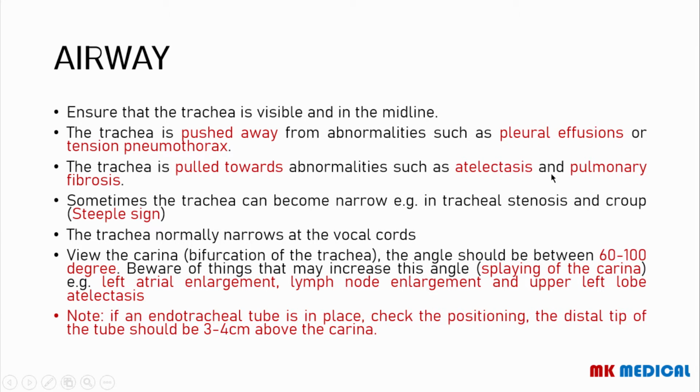You refer to that as splaying of the carina. Splaying with an L, not an R. So it's splaying of the carina. And there are a few things that can cause this. If the left atrium enlarges, the carina can be splayed. If they have some lymph node enlargement, it can lead to splaying of the carina. Even upper lobe atelectasis can lead to splaying of the carina.